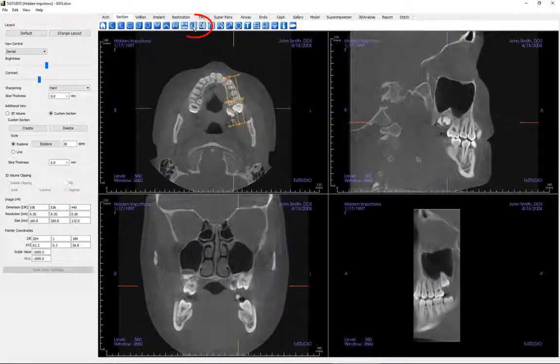The angle measurement tool is used by clicking the first point, then the vertex, then by clicking to add the last point to create an angle. A number in degrees will automatically be displayed for the angle, and the length of the rays will be determined. Click on the measurement and press Delete to remove.